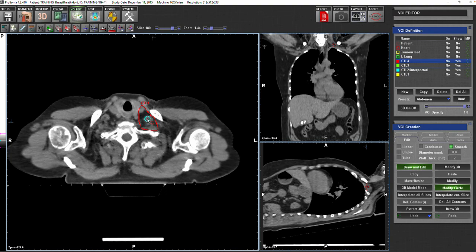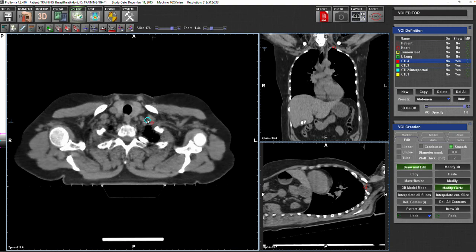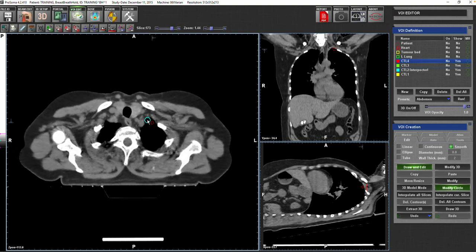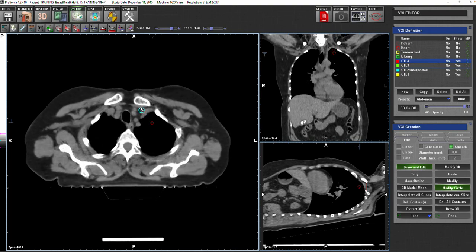And then go to the caudal edge or the caudal end of this level, CTL4. Now you are looking at the table, okay? So we'll go down, and it will tell you that when you go down, CTL4, anatomically, should end at the clavicular head, isn't it?